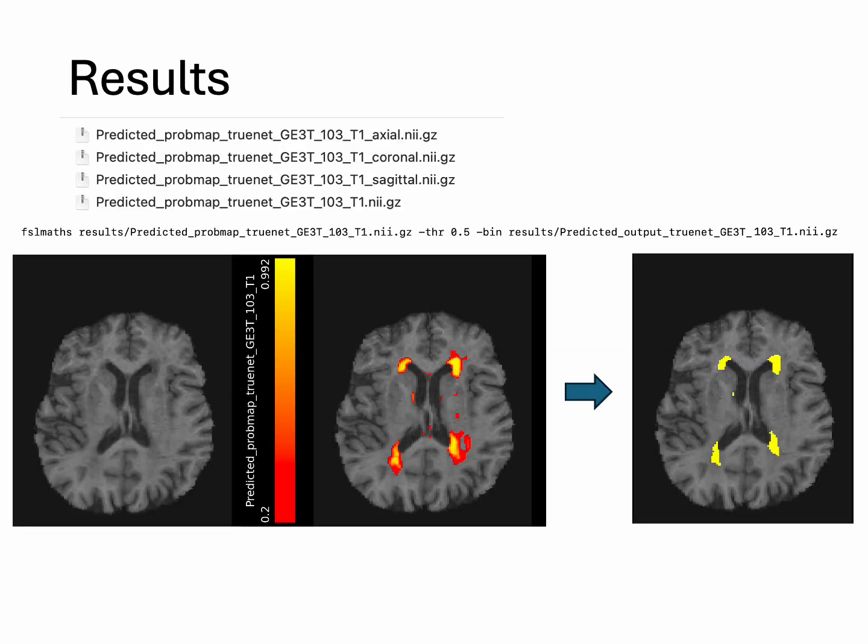Okay, so the results. I have shown here the main result and also the intermediate ones. The axial, coronal and sagittal results are shown with the corresponding post appendages. So you can see axial here, which is the axial output, coronal 3D volume and sagittal, and finally the combined output, the final output is given here, which is essentially without any post appendage. It just shows that this output was detected using just T1 as the input modality, using a model which was pre-trained only using T1. If no modality name is specified, it means it's trained using both.